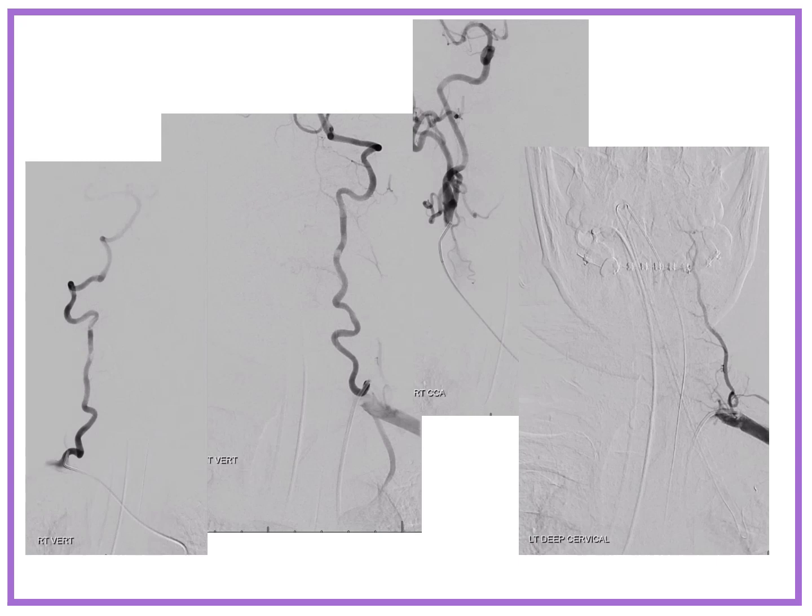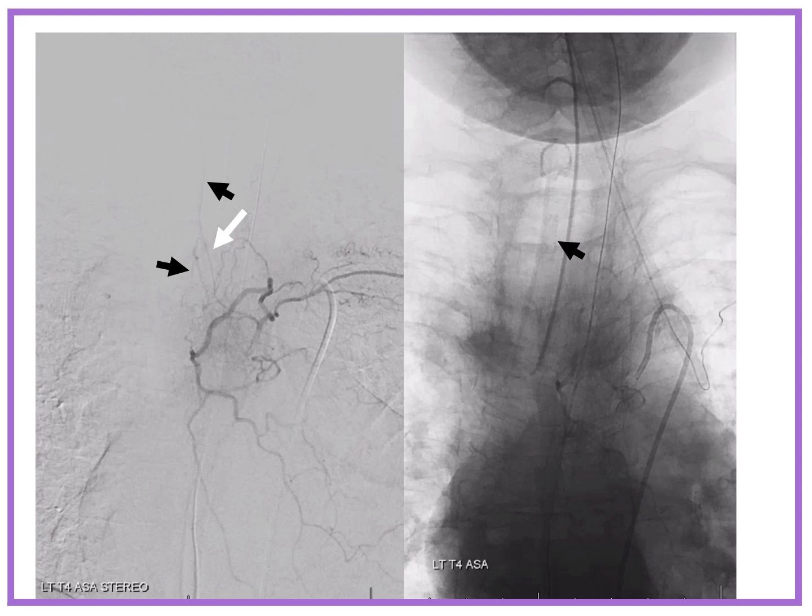And also, not to forget the fact that this might not be this person's last fusion. Who knows how many fusions are in store for this unfortunate person. So we're going to map out everything for the future. So here we are, no anterior spinal, right? On we go.